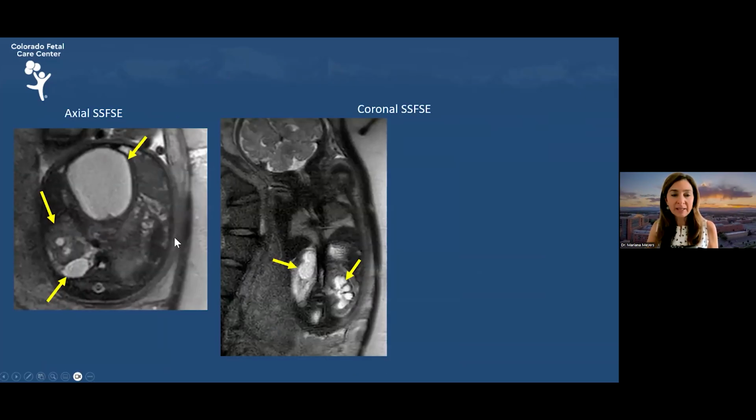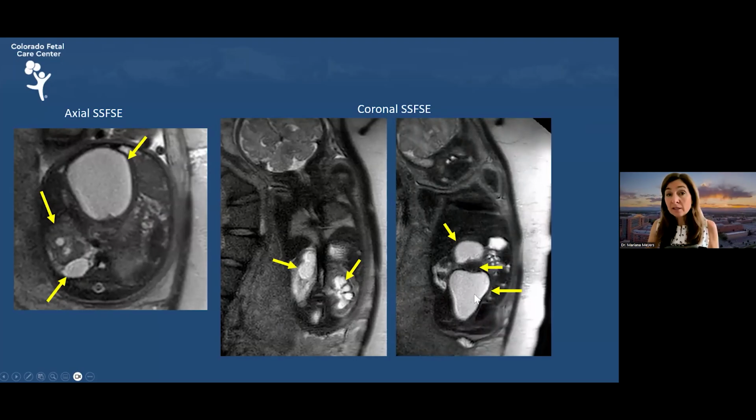So in this axial plane T2 image, you can see this cystic collection or cystic structure, the kidney that has a cyst posterior to it, and it corresponds to this hourglass perinephric cystic collection. The kidney underneath looked very abnormal. It had very bright signal in the cortex with cystic dysplasia, and the contralateral kidney had hydronephrosis. Well, more anterior to that was this cystic structure, which was the vagina, the cervix, which is going to have dark signal intensity, and the uterus right on top, fluid filled.